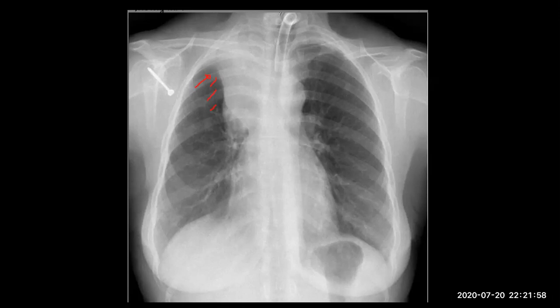What is your diagnosis? Bronchogenic carcinoma. Why? Do you see any mass lesion here? There is an opacity at the right hilum. Okay, there is opacity here. What is the concavity here? Here you see a concavity adjacent to the lower margin of the opacity. What is that?